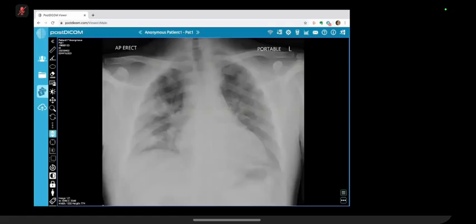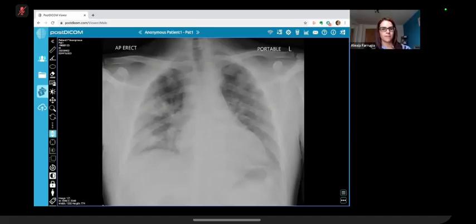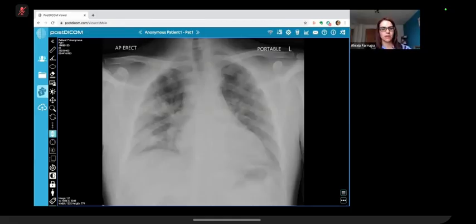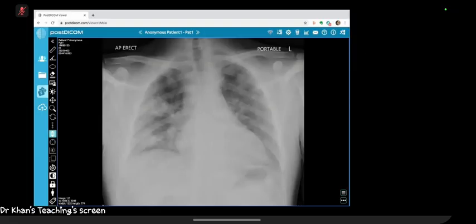If the patient has clinical symptoms of COVID, then this can represent COVID. Another differential in an otherwise normal patient of this age group could be an underlying vasculitic picture with pulmonary hemorrhage or consolidation. So I would write my report that COVID is likely if the patient has a history or clinical symptoms of COVID. It would correlate with PCR. To confirm, I would go with a CT thorax.